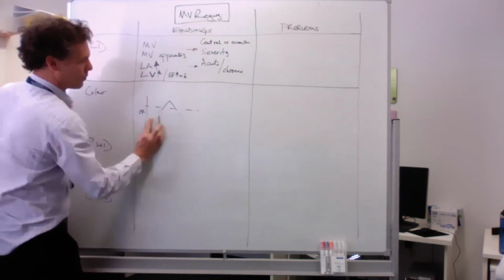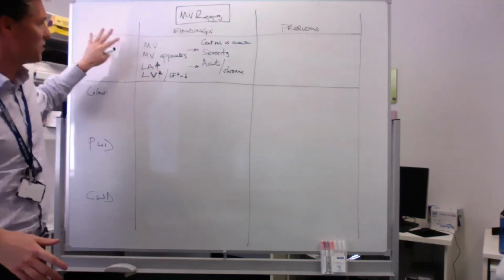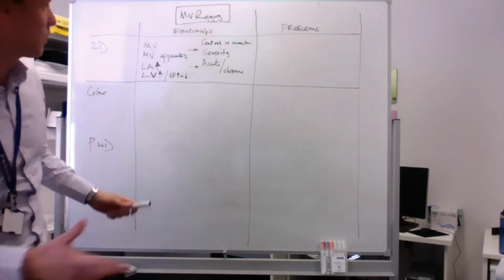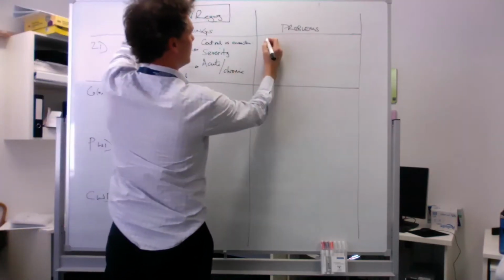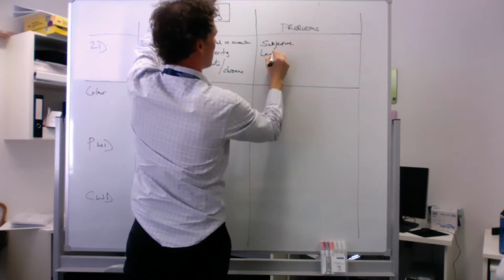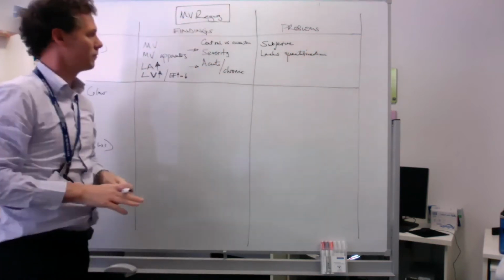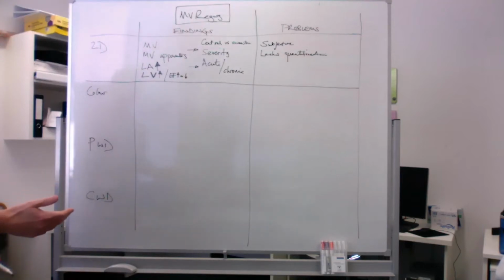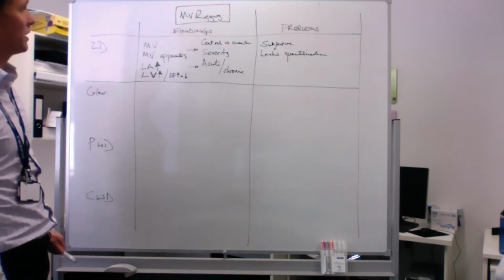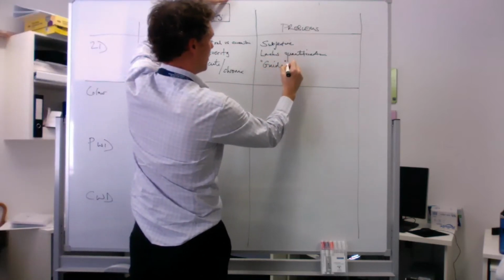Okay. So what are the problems with this? Team, tell me, what are the problems with some of this 2D assessment for mitral regurg? So it may not be that accurate. Yeah. It won't allow for quantification. Nice. It's answering a few questions, but it's not answering the hemodynamic assessment question. Subjective and lacks quantification, yeah. It can help guide us. Well, let's say it's a guide.